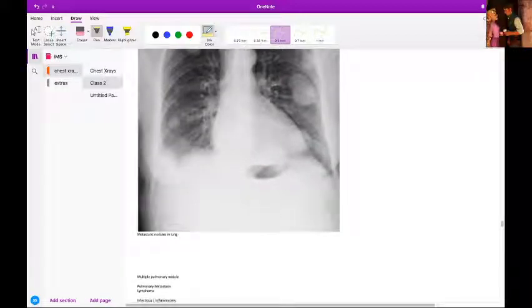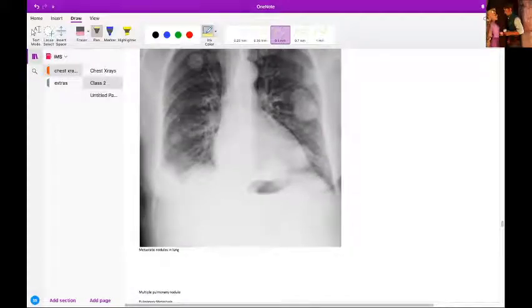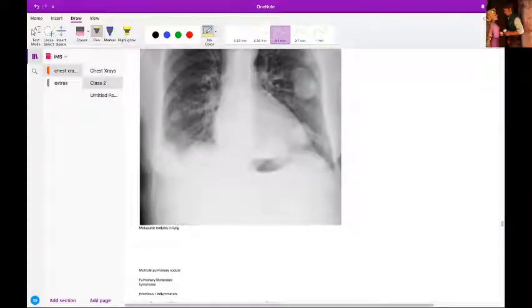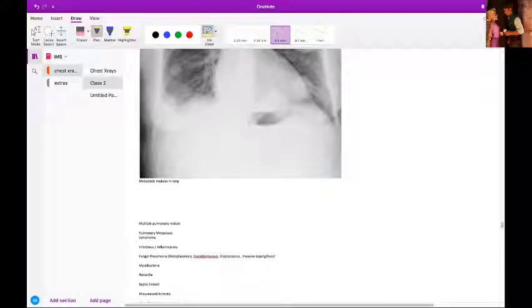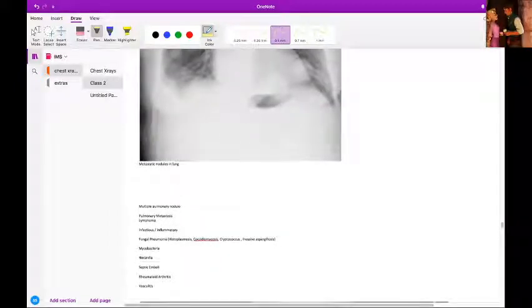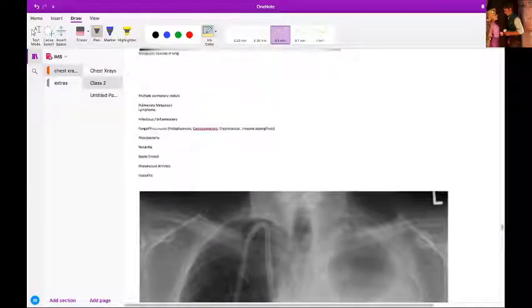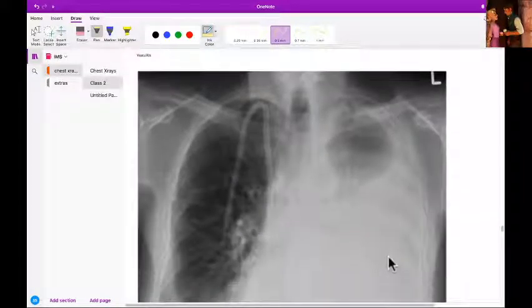Okay. Now, what are other causes of multiple pulmonary nodules? TB. Yeah, TB also. Okay. Then mostly fungal pneumonia. Did I put a picture of that? Okay, fungal pneumonia and stuff. Yeah, sarcoidosis. Anyways, then I'll move to the next.